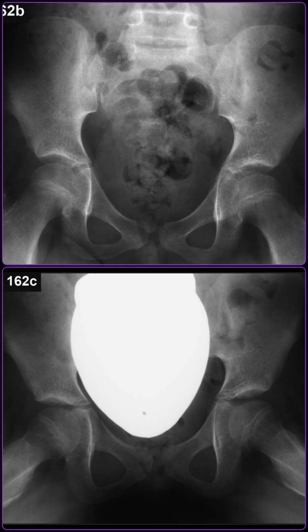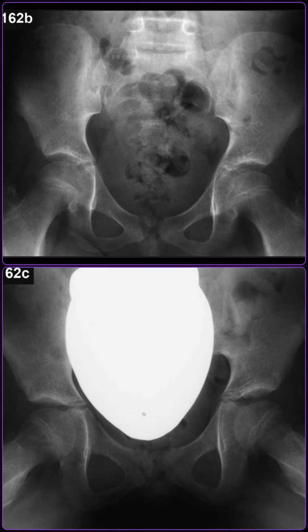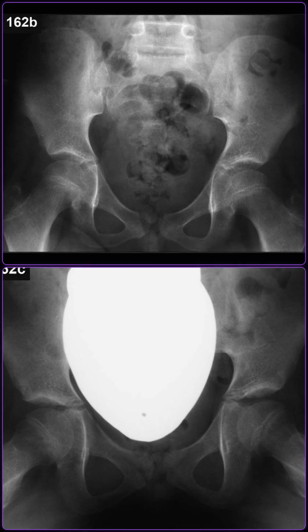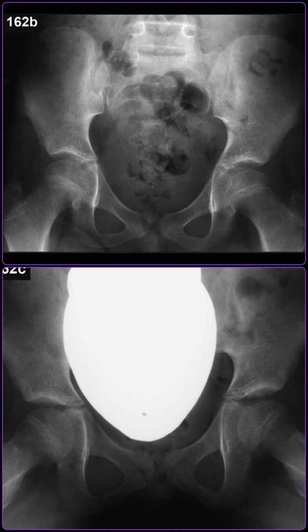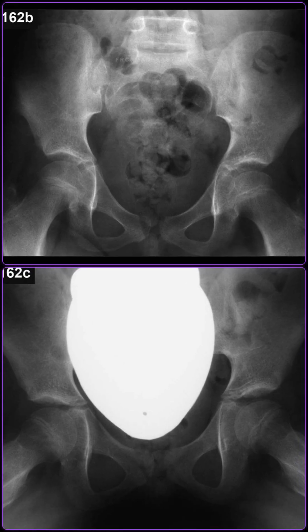I am showing you radiographs of a child's pelvis. Describe the findings and explain their significance. The anteroposterior pelvic radiograph of the child demonstrates a subtle, subchondral radiolucent line parallel to the articular surface of the femoral head, which represents the crescent sign of early avascular necrosis.